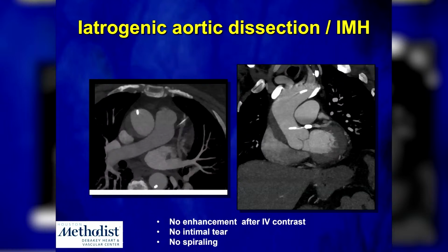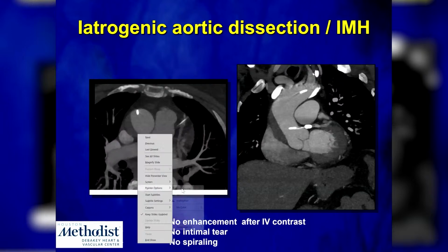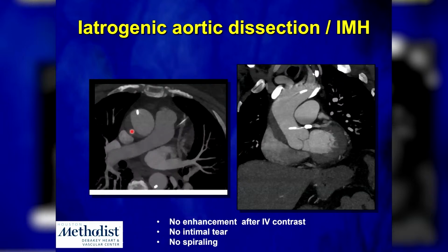But notice that when I give contrast, the area is not enhancing. So that's number one, unlike classic dissections where you're going to see contrast going into that area. And then number two, there is no intimal tear.